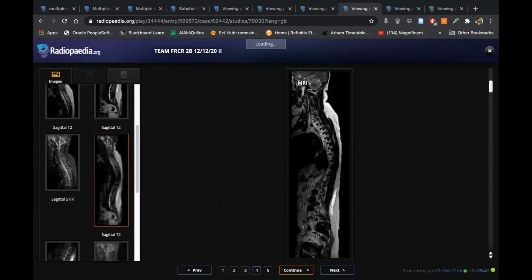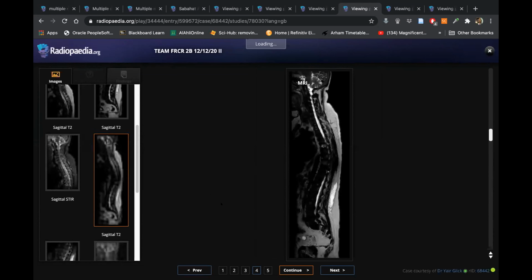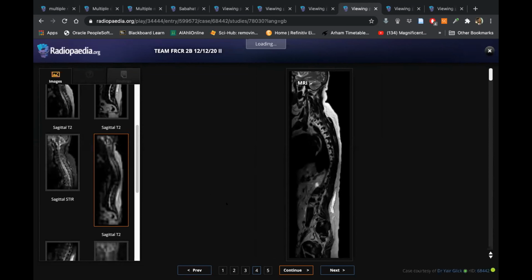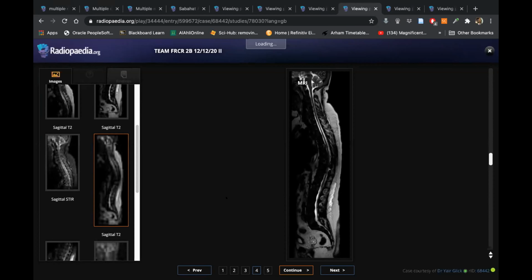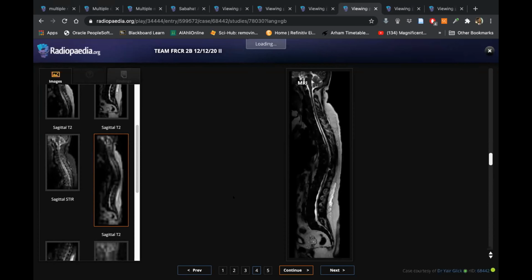So can you sum up everything now? Whatever you have seen on X-ray, on CT, and on MRI? So the native kidneys are small, atrophic, with multiple brown tumors throughout the axial and appendicular skeleton. Some in the posterior elements and in the vertebral bodies compressing over the spinal canal and over the cord. So significant compression over the cord.